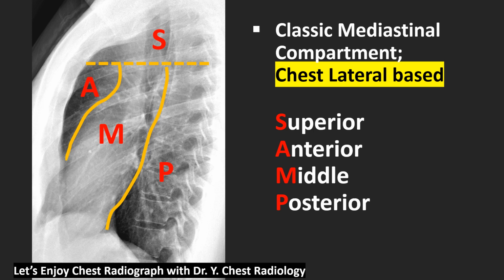Let's look at this chest lateral film. This is the usual concept of mediastinal compartments. This is superior, middle mediastinum, and anterior and posterior. It is easy and simple.